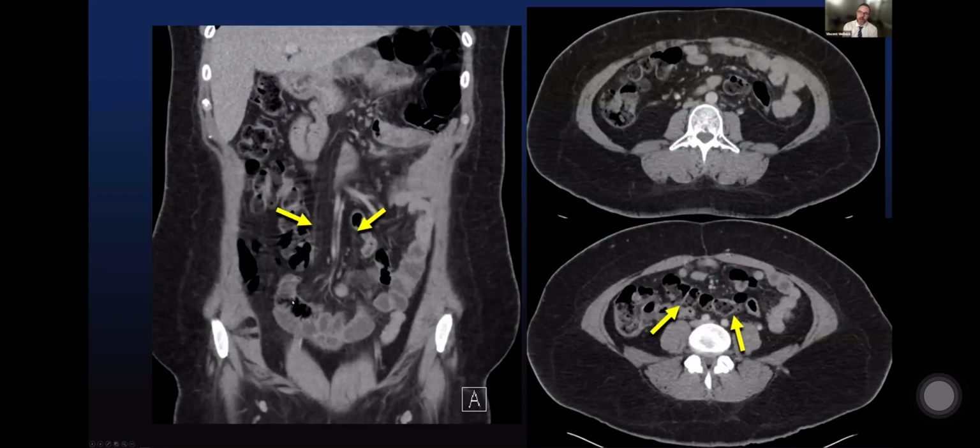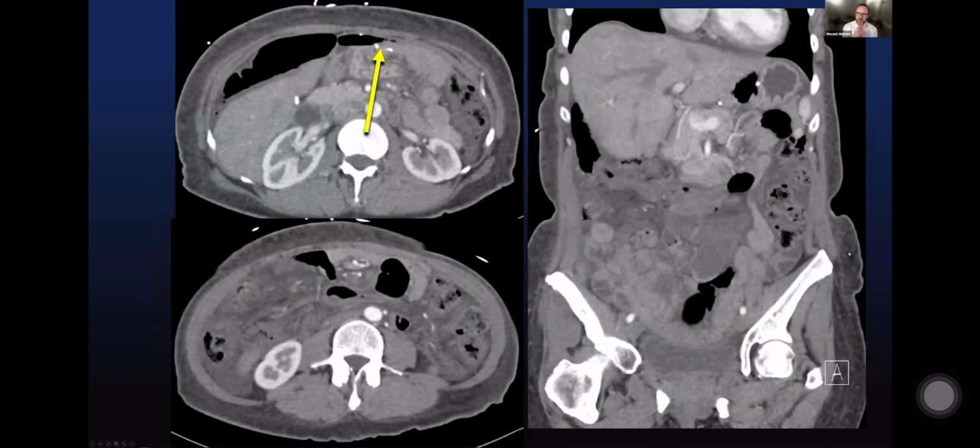So clearly an abnormal anatomic relationship, but no small bowel obstruction, no mesenteric edema or ischemia here. This is a non-obstructed internal hernia. A laparoscopy confirmed it. And these are the patients we try to catch early before they get a closed loop obstruction. One important sign, in addition to abnormal anatomic relationships of the bowel, is the shifting anastomosis sign.